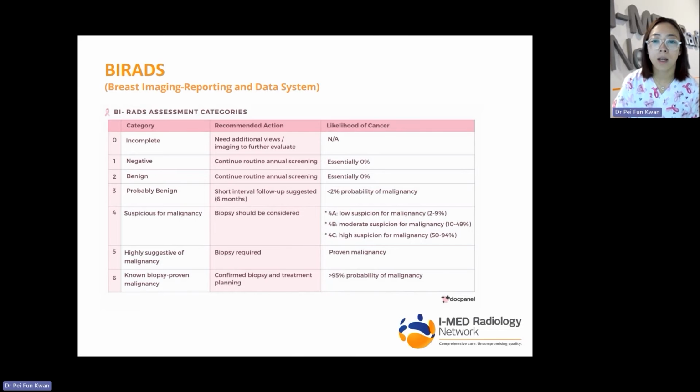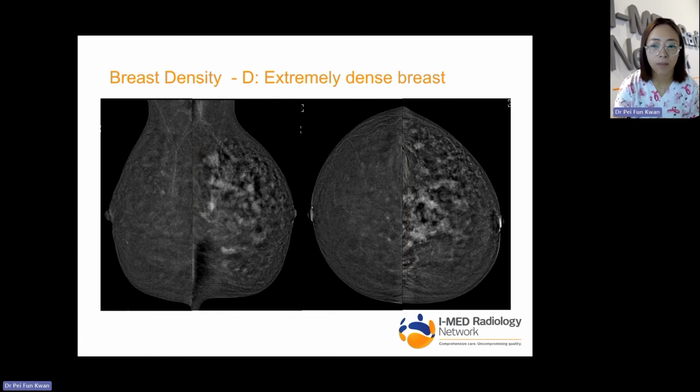So that was breast density and contrast enhanced mammogram. And we can see that with extremely dense breast tissue and heterogeneously dense breasts, without contrast, it's definitely challenging for even breast radiologists to detect breast cancer, which just simply cannot see through dense breast tissue.